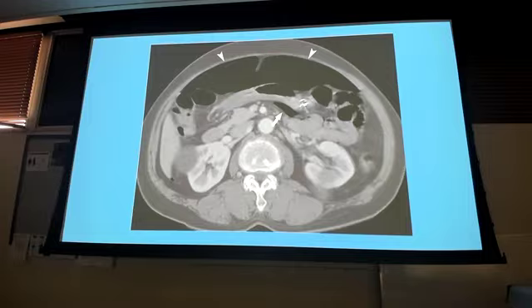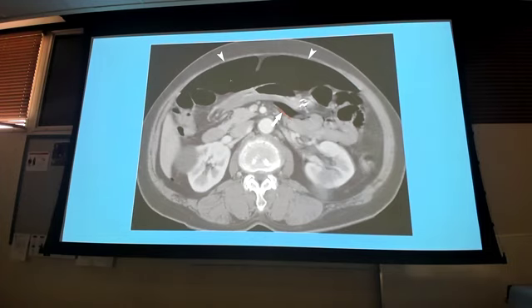Pneumoperitoneum, showing you what it looks like on CT. It's all my air up against the wall of the abdomen. Shouldn't be there. It should be nice and contained in the bowel, like right there. Right? And so when this is more air in between the organs, that's not nice and contained within the bowel. Plus I got the air out here. So this is just showing you a pneumoperitoneum. This one in particular is due to a perforation in the gastric body, but can't tell that.